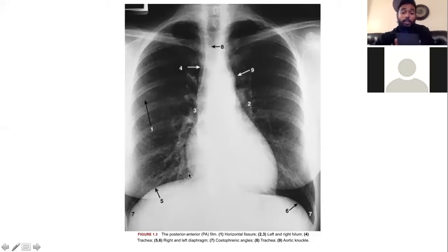if the patient takes a deep breath in, you see how the curve strains up. You can see kind of the same thing on the caudal side, but down here. And if you see the same thing here, that's going to be your IVC.